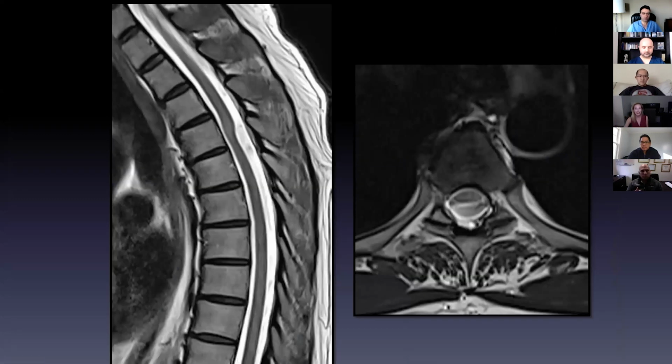All right, next case. So similar but different. Let's let Dr. Baj take this one if he's paying attention. Otherwise, I'll take it.